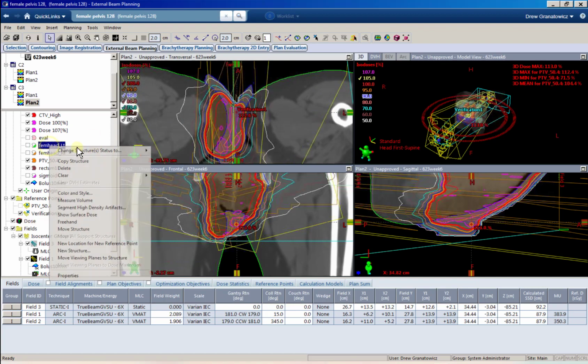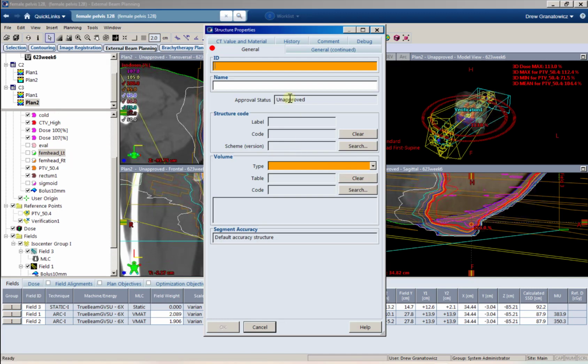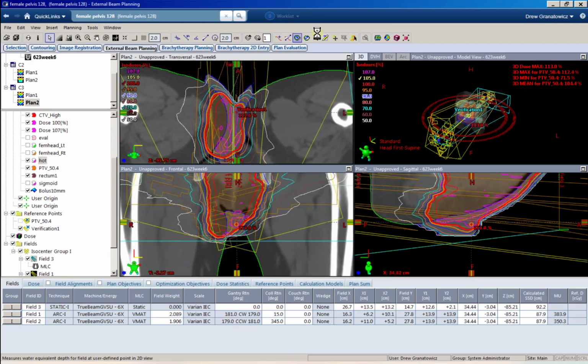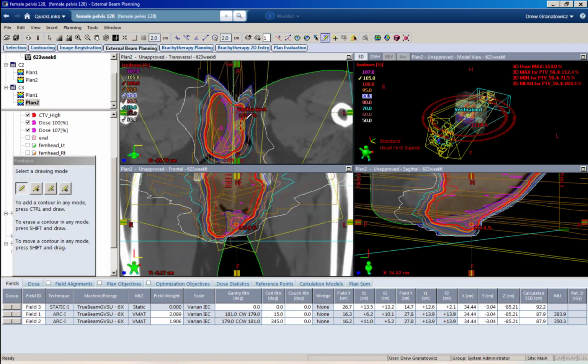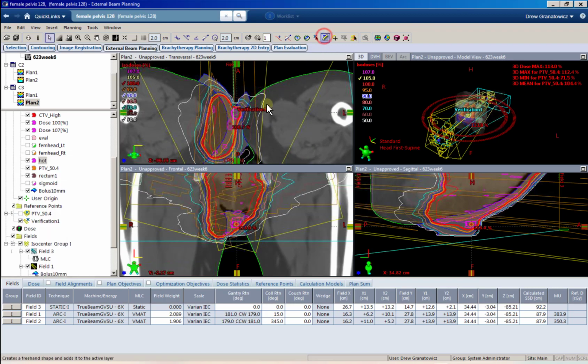So what you can do is, again, just create another contour and focus on that very specific spot, and you can slightly overdo it if you need to. So we can go maybe one slice above, right on the slice, one slice below. We're going to really focus on that one spot, okay?